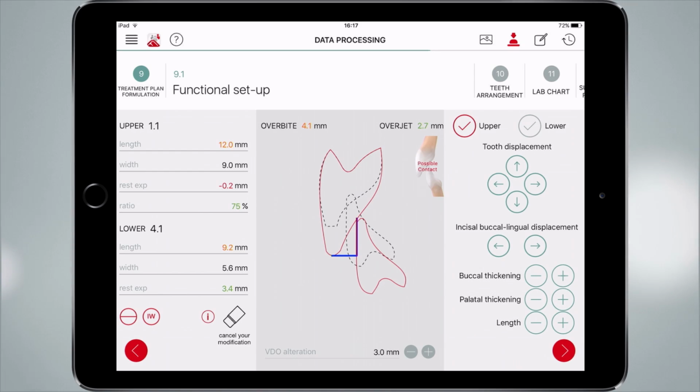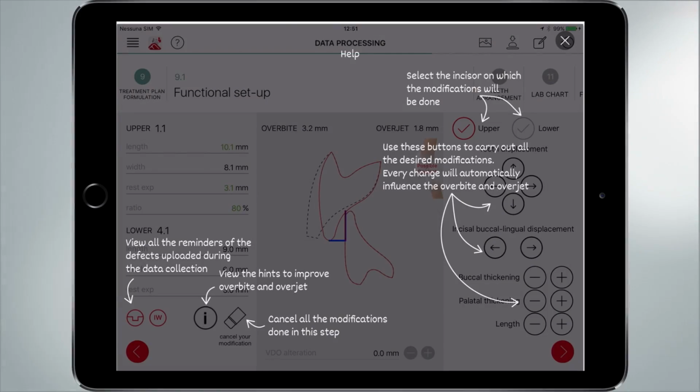What I want to explain even better now is that in this scheme here, you can find a lot of information, incredible number of information. I would like also to explain to you how to use the app. On this area here, you have the question point, and the question point is how to move your hands on this screen. So now you can understand that there is an explanation of all the questions you can have on how to move your hands. So that is very, very important.